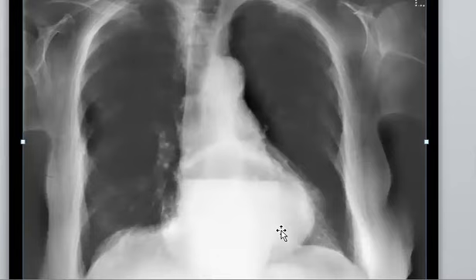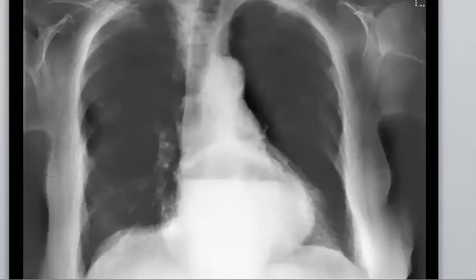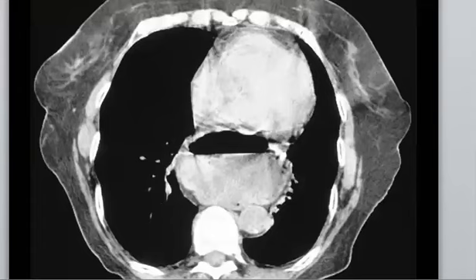So this one is clearly a hiatus hernia. This is with a fluid level. What other differential should you mention if they ask you about the differential? Cyst. Abscess, perfect. So when you find a fluid level, it is a hiatus hernia or it is an abscess. And there are other differentials, maybe some complicated cysts and so on, but yes. So this one is a hiatus hernia.